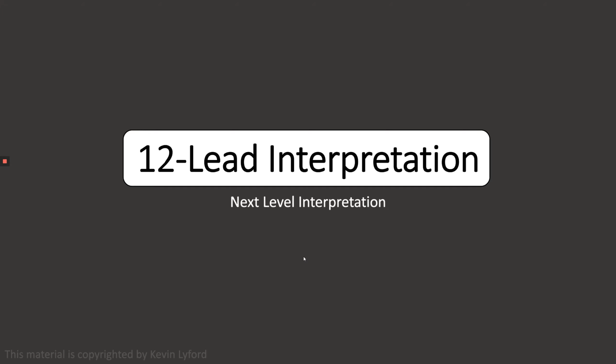All right, so in the fourth lecture today, we're going to talk about bundle branch blocks. Being able to identify these is very important because a left bundle branch block is something that is treated like a heart attack a lot in emergent situations. And also because of the way they look, if you're new at interpreting them, they can be very intimidating and confusing. So we're going to take a look at these and just dive right in.